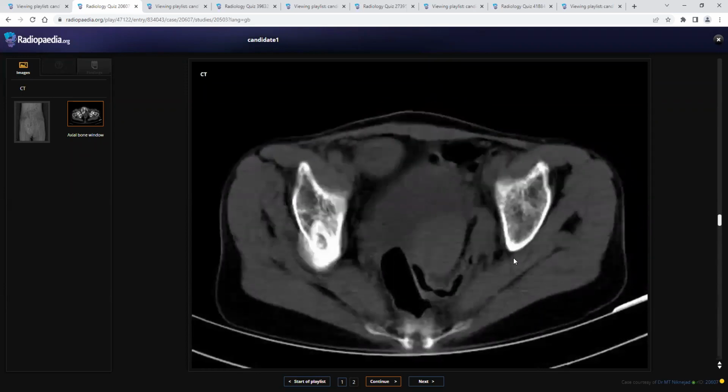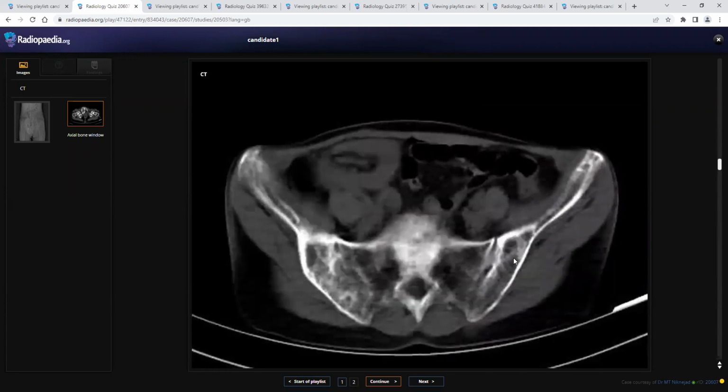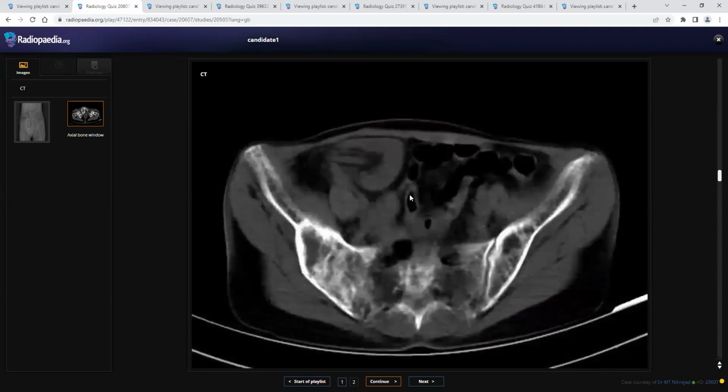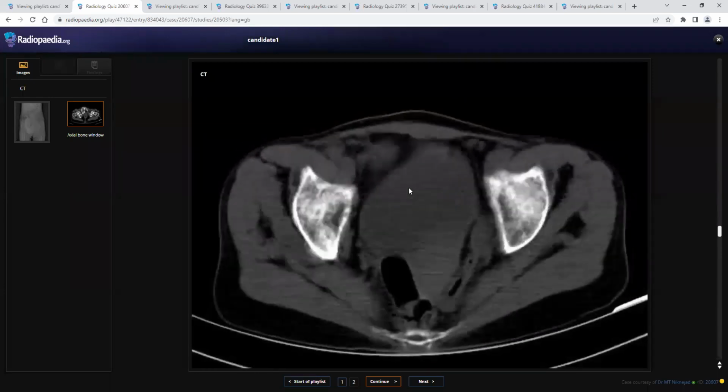But the final diagnosis in this case? Brown's tumor, secondary hyperparathyroidism because of CKD and the transplant kidney. Does the Brown's tumor come exophytic like this, or expansile like this? Expansile. Okay.